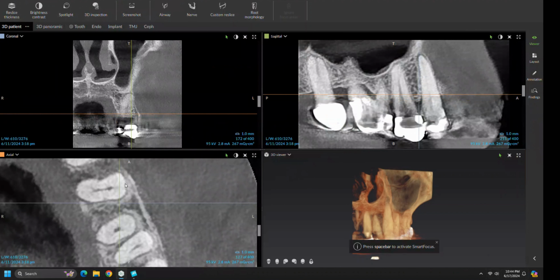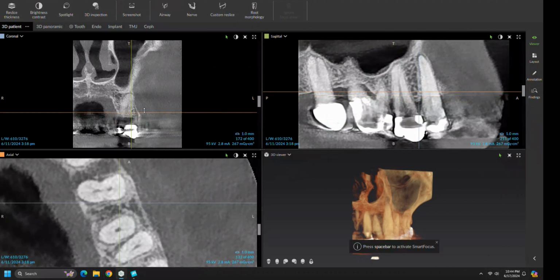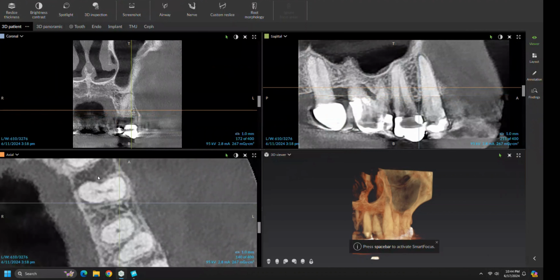So I'm looking around the tooth here, and this looks very normal. This looks a little widened. We've lost the cortication of bone around the palatal part of the tooth, but at this level that's not uncommon. And as we go more apical, it really appears normal all the way around. The fact that we have a bifurcated canal suggests to me that the tooth is at higher chance for a fracture in this dimension here, so I'm keeping a closer eye on that.